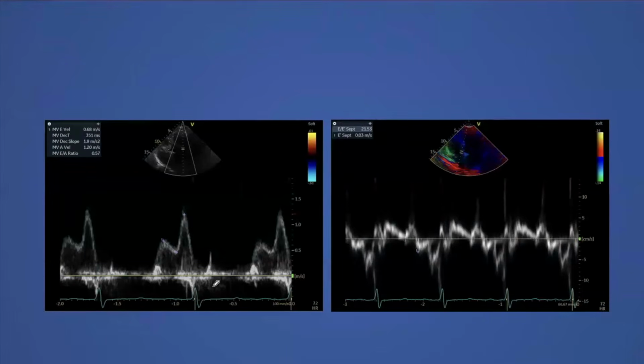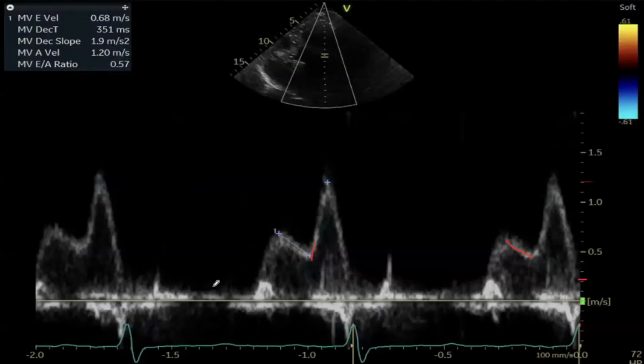And in this case, you can at least measure the E? You can measure the E, but you know that your A is overestimated. And if you go by diastolic dysfunction guidelines, they say you cannot use them. Yeah, you cannot, because to diagnose diastolic dysfunction is really tricky business. And if you see the list of things that prohibit diagnosing, it's so many.